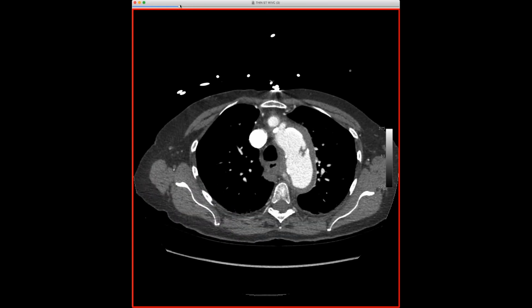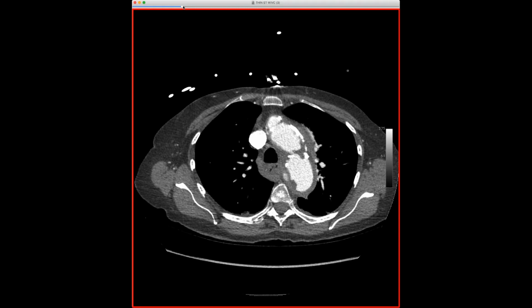And we're just not seeing a flap. You have this intermittent filling. And you're correct to point out that there's a lot of atherosclerosis here. That's usually protective against dissection, and it may be operating in this person. When you get a lot of atherosclerosis, you actually weld the layers of the aortic wall together, and you make it difficult to get a clean dissection plane and fill out two channels very nicely.